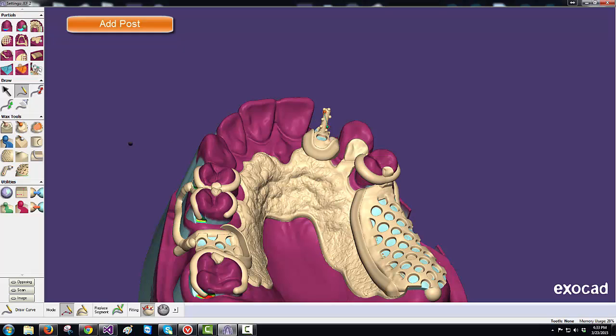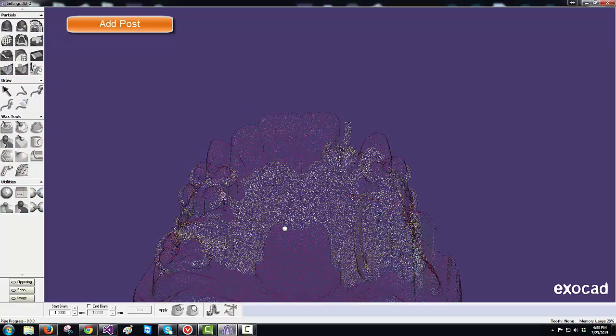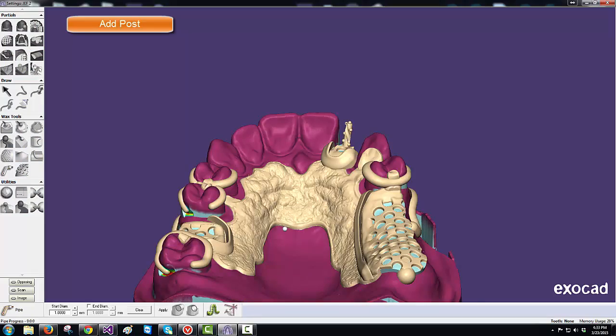Double click the end of the line, choose the Pipe tool in the tool palette, set that to typically 1.0 or 0.5. Click on the curve. This is a positive pipe, this is a negative pipe, and we want to use the negative or subtract pipe tool to create that pipe thread on the post.